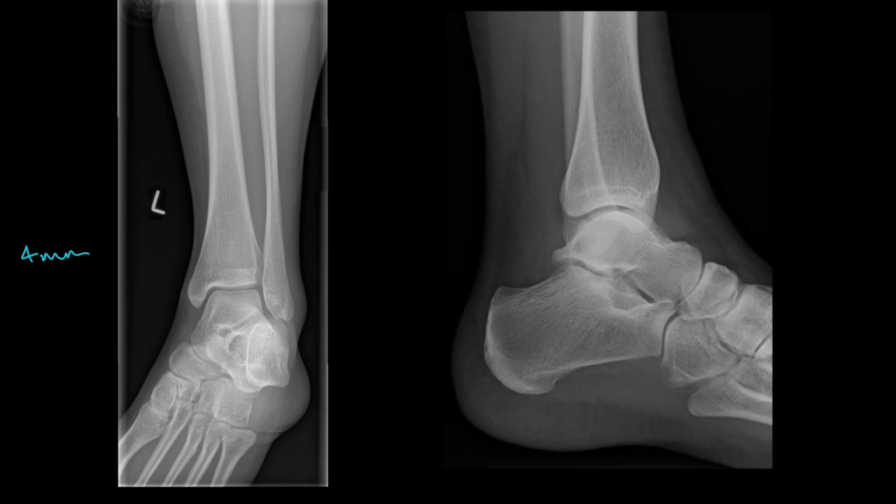Next, you would want to trace the bony borders. The important things to point out here: we have obviously our tibia, and again trace the whole length of it. We have our fibula. Communicating with these, we have the talus. We can see our calcaneus. Moving more distally, we've got our navicular, our cuboid, our medial, intermediate and lateral cuneiforms, and then the base and part of the metatarsals. Laterally, again, we can see the tibia.